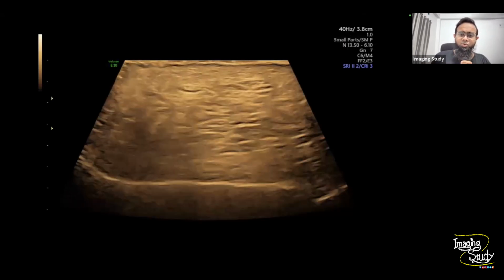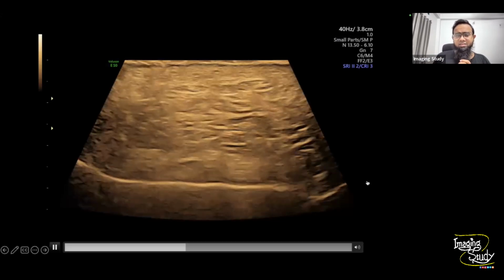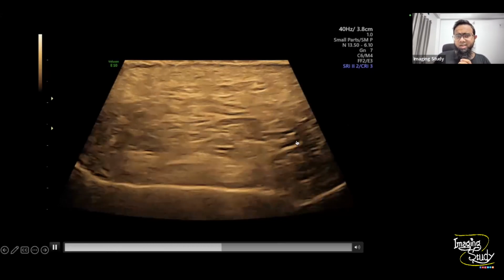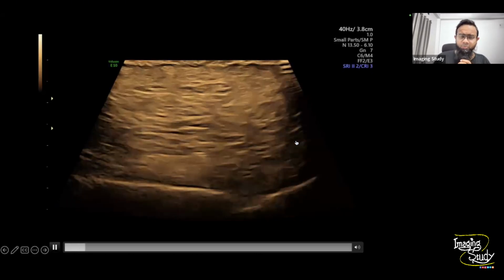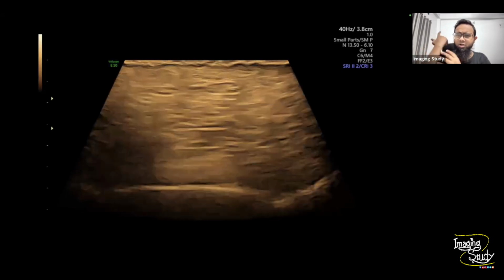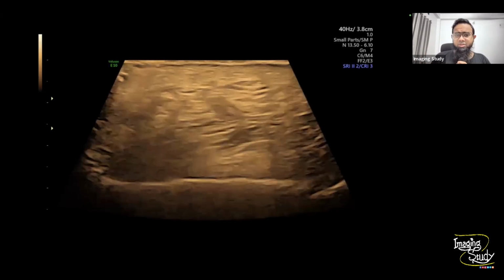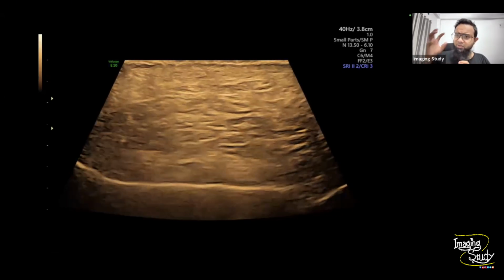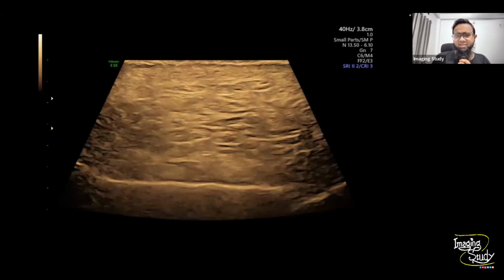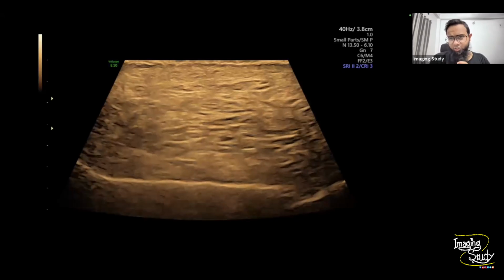And now I think most of you can easily say what the diagnosis is. You can see there is an echogenic mass with a striated pattern. This type of striation is very common in the subcutaneous tissue. So the echogenicity of the lesion is similar to the subcutaneous tissue of the body, so obviously the lesion contains fat. This is nothing but a lipoma. It was just like this ball-like shape. So this is a big lipoma, and it was pedunculated, attached to the left perianal region.